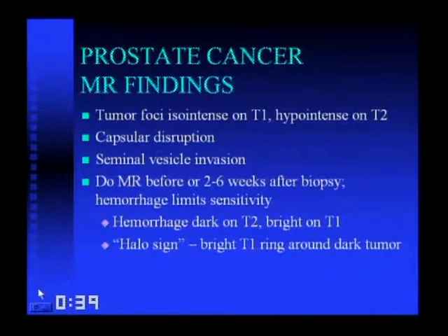bright peripheral zone will have a dark focus. Prostate cancer is dark on T2 scans. Everything looks the same on T1 scans. You look for capsular disruption, invasion of the seminal vesicles. It's very important to either do it before a prostatic biopsy or wait at least 2, if not 6 weeks after a biopsy, because hemorrhage will mess your scan up.